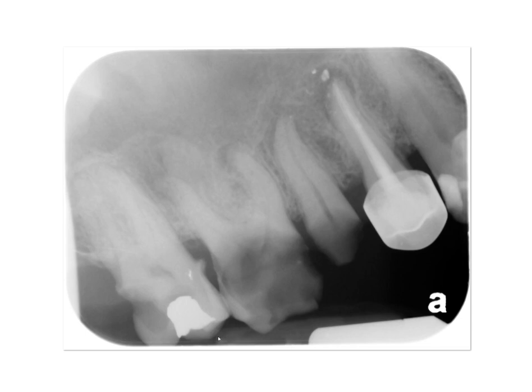Again, looking at this maxillary PA, the patient is biting on this bite block, but not all the way, such that these premolars are not touching this bite block. So this would be a case where the phosphor plate is not placed parallel to the occlusal plane. What else do we see? We can vaguely make out the floor of the maxillary sinus. Obviously this tooth, as well as this one, has a radiolucency which is consistent with apical periodontitis.